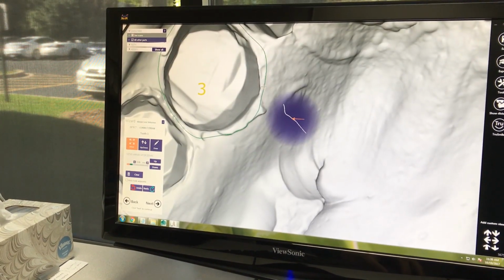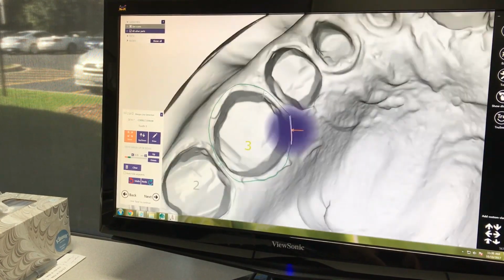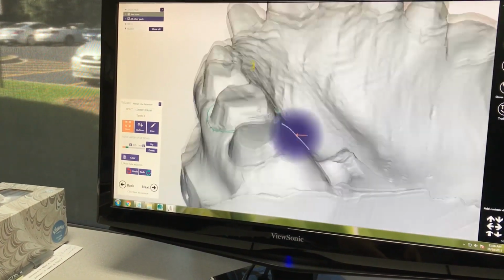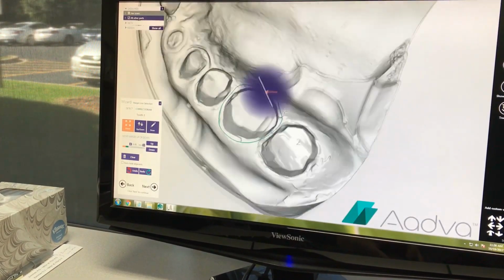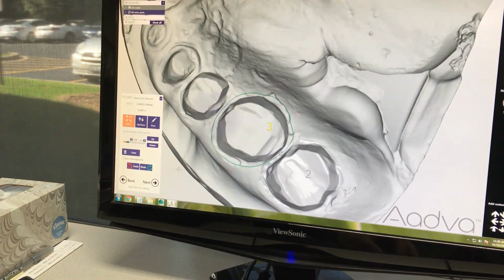So what are the red lines, Nora? It's calling like it's not correct. So yeah, it's like the undercut, and things like this.